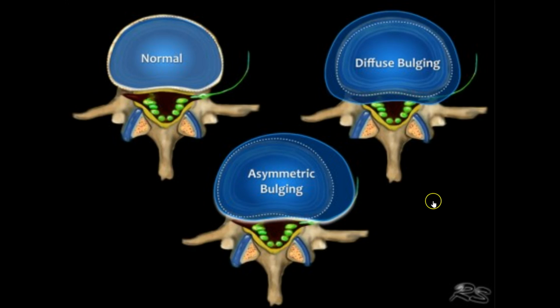Disc bulging is an age-appropriate event that is usually innocuous, but it will cause progressive spinal stenosis and predispose to acute radicular features in the right clinical context. So it's important we know a little bit about the terminology of disc bulging.